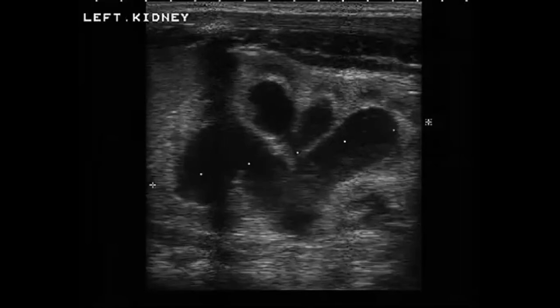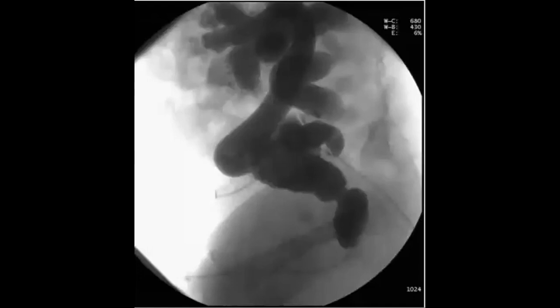So probably the clinician will ask you to do something like this, and the request will come to you, and you probably agree. Nice. So you agree with this request, and you will do this. What is this? It's a pediatric age group, as you note. So this patient is a 2-week-old baby boy who comes to you. MCUG, perfect. This is the examination.